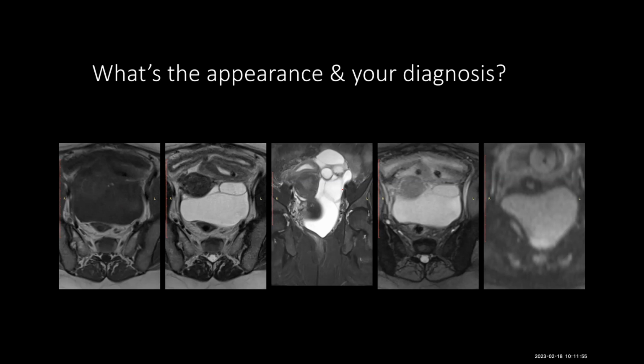Hello. Hi. Is this my case? Yeah. Okay. So we've got an MRI through the pelvis. That's a T1. Yeah, sorry, I think someone muted me. Okay, so we've got an MRI through the pelvis. We've got T1, T2, a fat sat in the center. Okay. Another fluid sensitive, what looks like another T2, it's a fourth from the left, and then possibly a restriction diffusion image on the end.